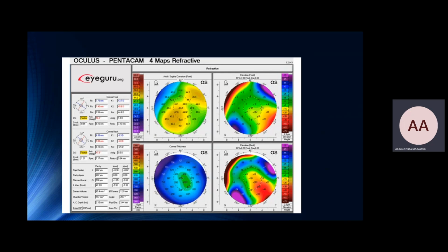So I need to check first the data and the eye and compare the examination date. Then I need to check the quality specification first. It's the other, so proceed with caution. Beginning, I'll look at the K values.